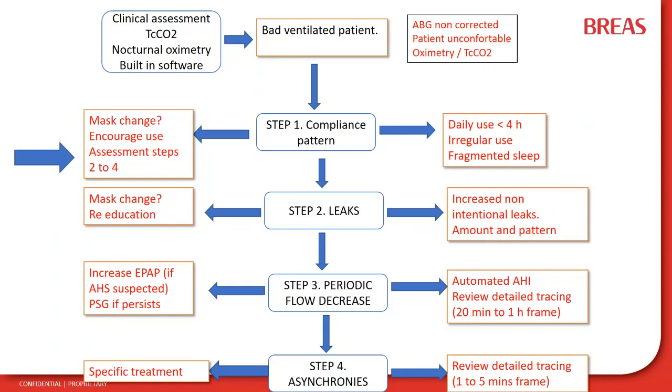This is an algorithm I like very much because it contains the procedure you can follow to read ventilator waveforms. Never forget that the reading of the tracing should be linked to the clinical assessment with the transcutaneous CO2, nocturnal oximetry, symptoms, arterial blood gases, and so on.